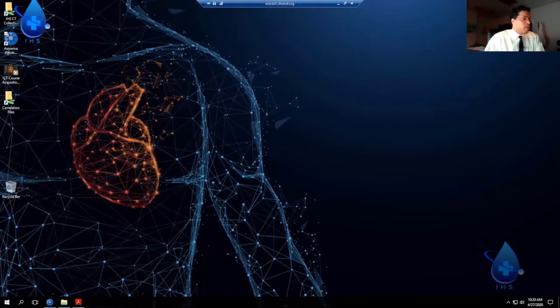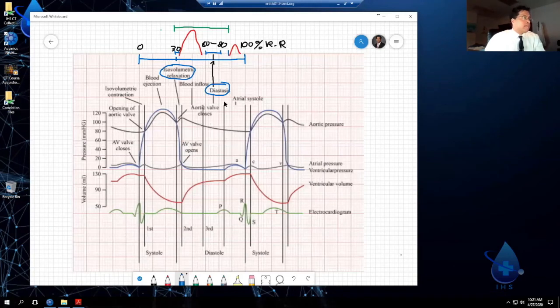So the whiteboard again, key is if you only have one phase, pick 75%, right in the middle of diastasis. I use that 75% for the great vessels, for the entire chest, for the series that goes with the thoracic housekeeping step 3 in the algorithm.